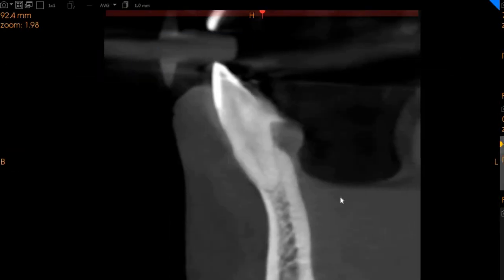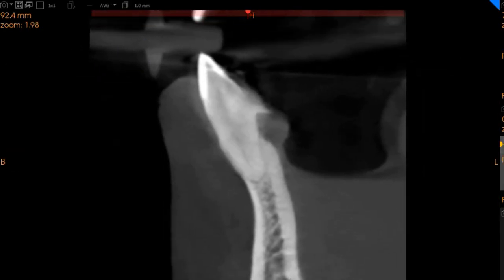Now, we're going to take you from canine. This is the transaxial view. The transaxial view is basically the proximal view. So we basically have only the lower one third of the tooth covered with bone. The rest, as you can see, is above the crest of the bone. We also have a significant chunk of calculus. The pocket depth is approximately 7.2 millimeters, and here you can very clearly see a big chunk of calculus on the canine.